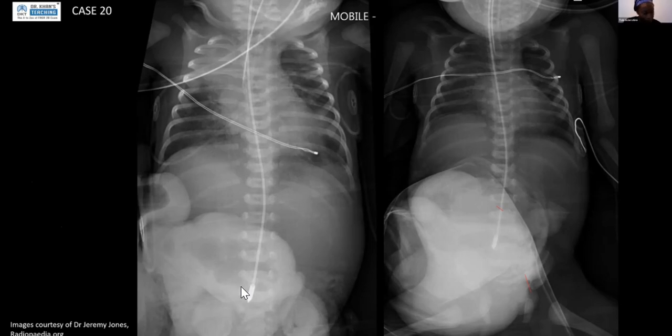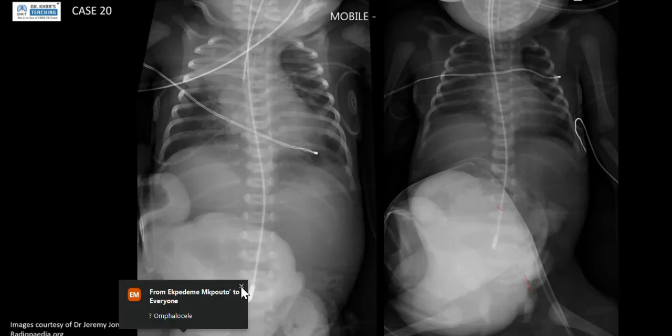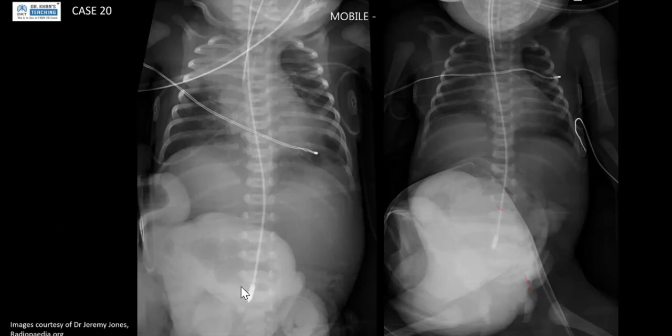Yeah. So other than that, I think there is a sign of pneumoperitoneum, because I think there is a football sign in the abdomen. Okay. What makes you think that? Describe where you're seeing it for me. Because I think there's a lucency overlying the liver, the left lumbar region. So I think it is compromised. It shows a football sign.